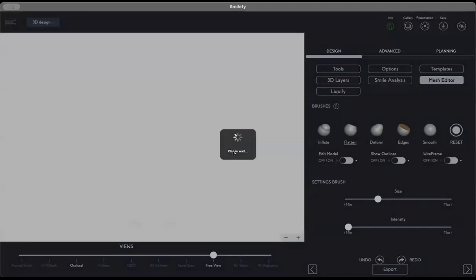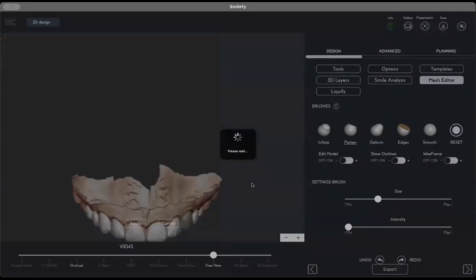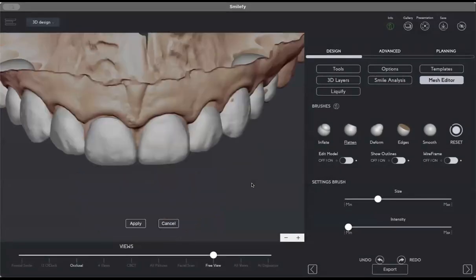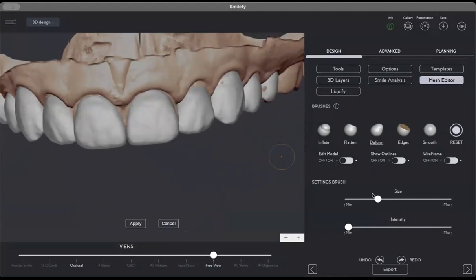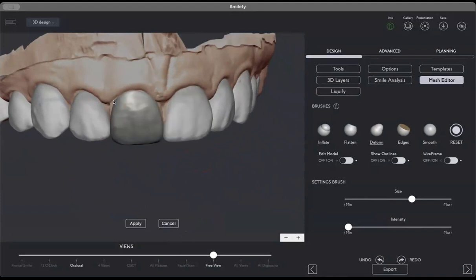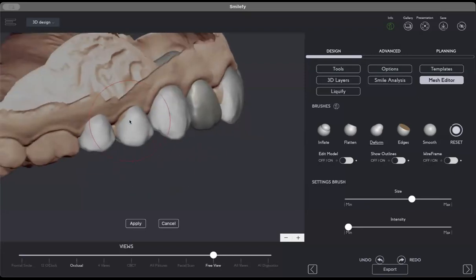Now, very important, this step is also in the process of being automated. If the design is going to be subtractive, we are going to have one option to say, analyze the position of the patient's teeth with the position of the design, and then create the design additive. So in here, you see all these changes are going to be done automatically, covering the patient's teeth here.